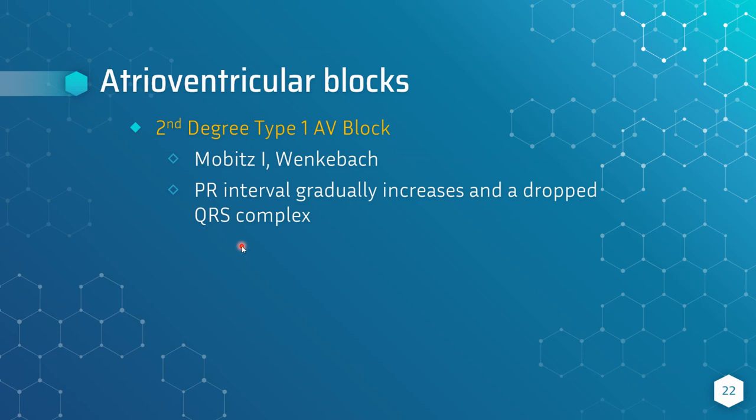So in Mobitz 1, it's actually usually vagal. A lot of people live in a Mobitz 1. So if you're an athlete, you do track, cross country, this rhythm itself is very high in vagal tone. So a lot of people can live in this rhythm, and it has a good prognosis. It very rarely needs a pacemaker, and since you have high vagal tone that contributes to this rhythm, you can always give atropine if the person's bradycardic because it's an antivagal medication itself.